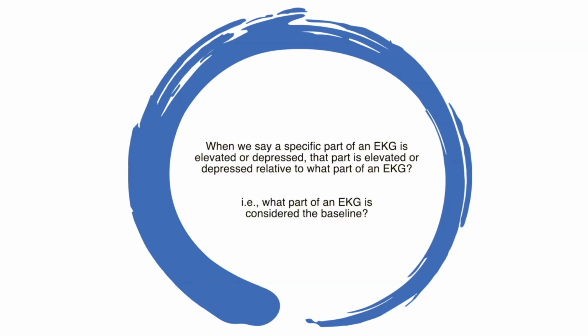Hello, everyone. If you've been in medicine for a while, you've probably heard someone talk about the ST segment being elevated or depressed. So, a quick question. When you say a certain part of the EKG is elevated or depressed, it's elevated or depressed relative to which part of the EKG? Go ahead and pause the video and think about an answer.